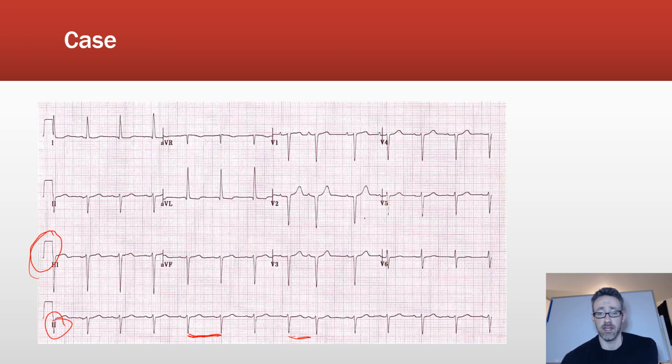Okay, and again, this one occurrence right here, it's hard to say, but it is possible that the P wave looks okay. So I can't really give you an idea of what that is at this point. All right, but let's take a look at some other things. The rhythm looks fairly regular actually. The P's are followed by a QRS.